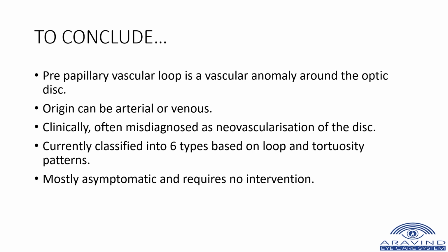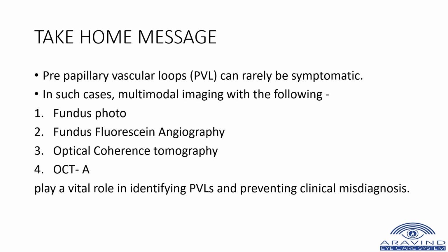Prepapillary vascular loops can rarely be symptomatic. In such cases, multimodal imaging with fundus photo, fundus fluorescein angiography, OCT and OCTA play a vital role in identifying these conditions and preventing clinical misdiagnosis.